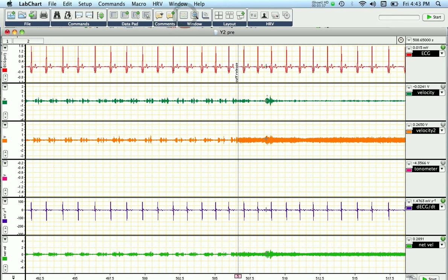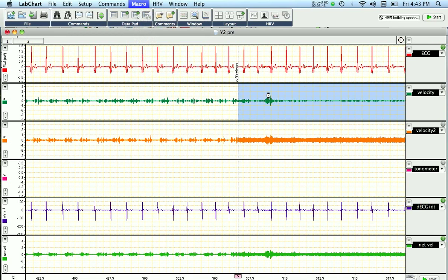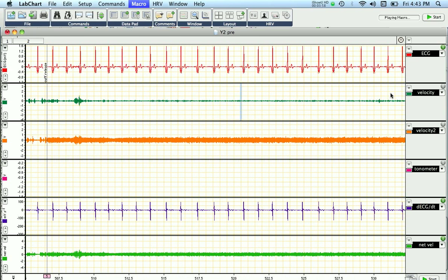So getting back to this here, what I'll do quickly is just give you an example. I'll run this. The computer highlights the whole area of 120 seconds. Then it'll sequentially go through the whole data set for 120 seconds. So you'll end up with about 1,200 data points relating to the blood velocity in the reverse direction.